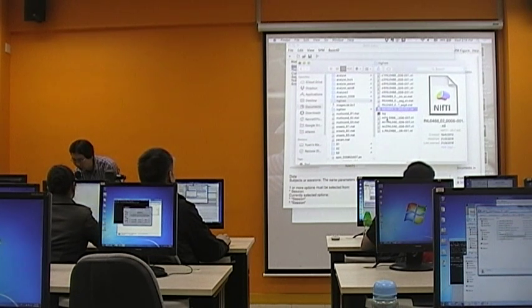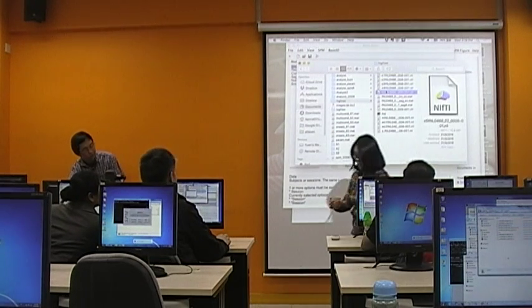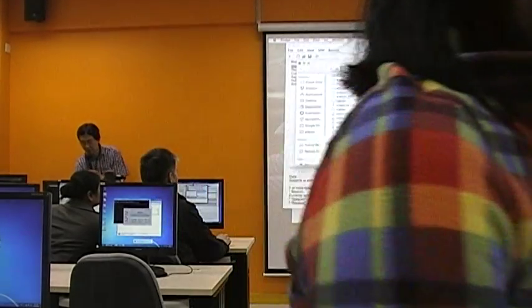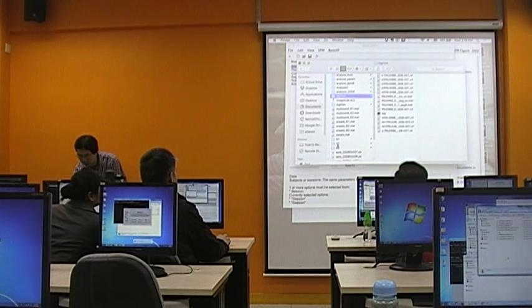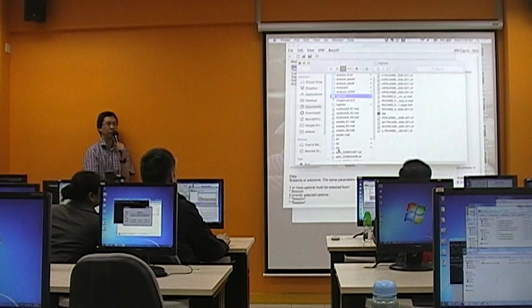And then after the segmentation procedure, we also have all this normalized. No, it's this one, because we haven't done any normalization on the T1. So here, from C1 to C5 is the result of the segmentation. And then you see there's S1, S2, S3. Those are the three folders containing the fMRI data for three functional runs.